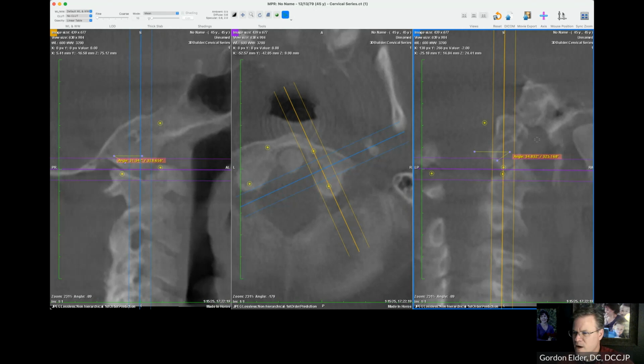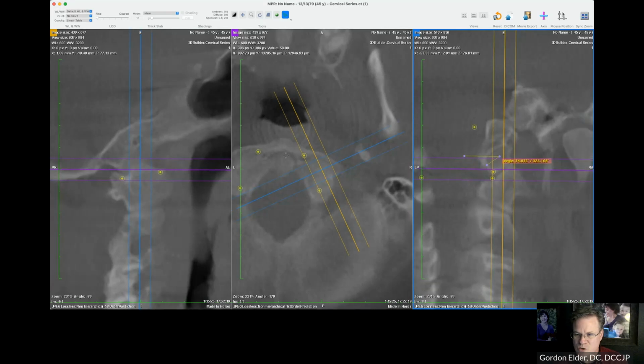Now I know how to line up my arms. I know how to approach the patient when I adjust them. I don't know what's misaligned yet. We haven't looked at that. So let's do that now. Now that I've got my measurements, I can start rotating things to get a little bit clearer picture. Now remember, we're at 10 millimeters. We don't always get the most clear picture at that. Sometimes I'll move it to 20 if I want to look at the whole joint.